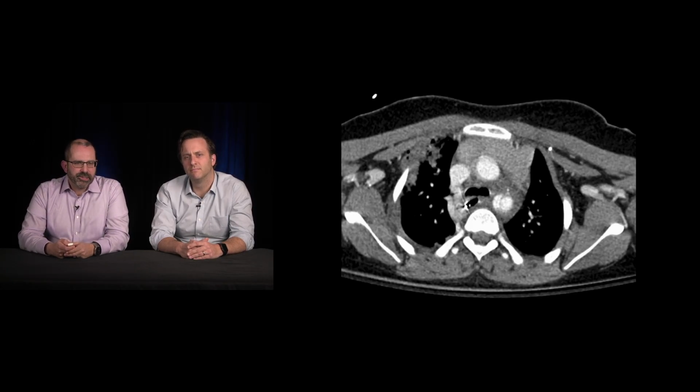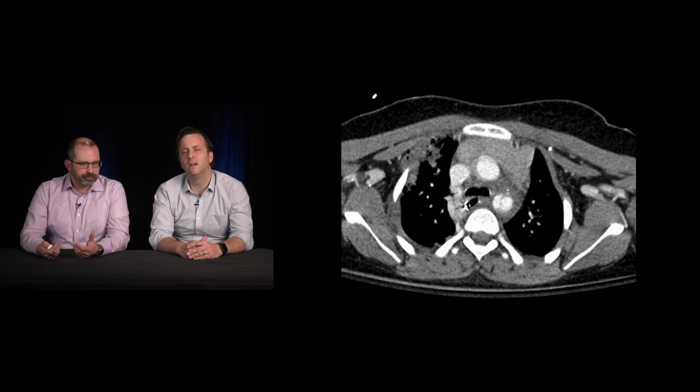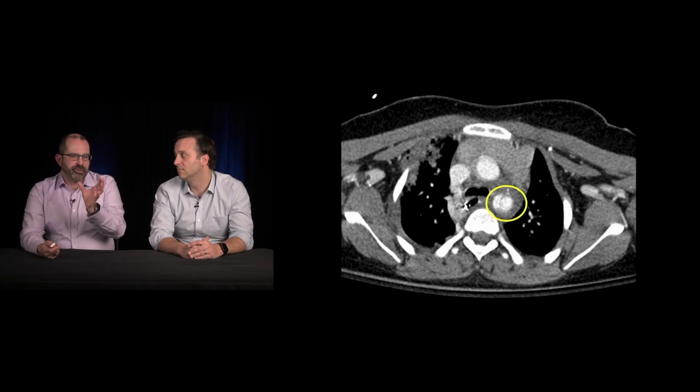Looking at some more examples, this one's pretty bad. You see a pretty obvious tear there with pseudoaneurysm, and then you see all this soft tissue density up in here, and that's all mediastinal hematoma, which also commonly occurs with this. And that honestly is what commonly contributes to that widened mediastinum we see on X-ray.